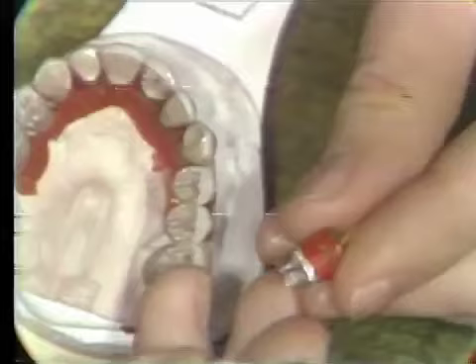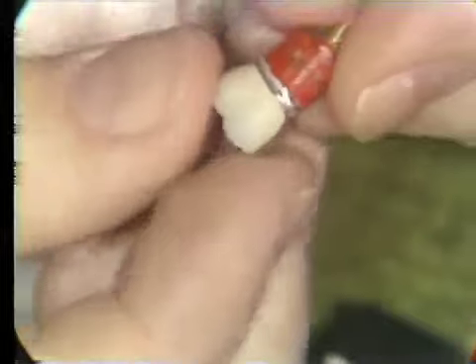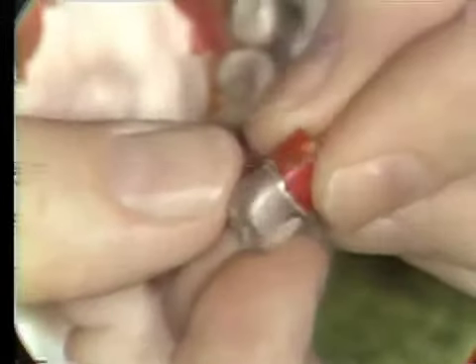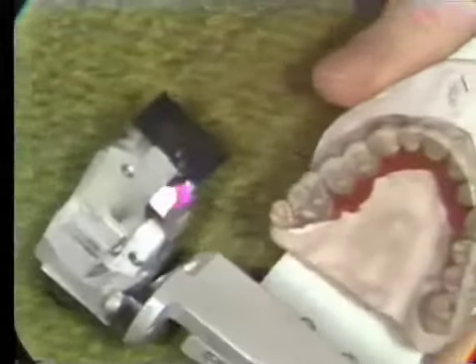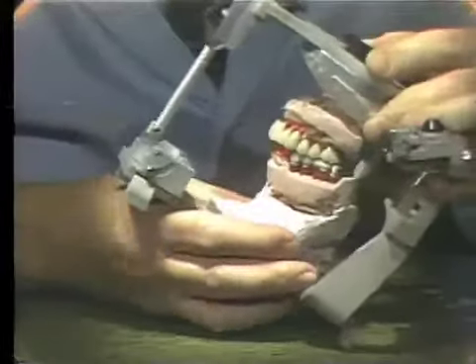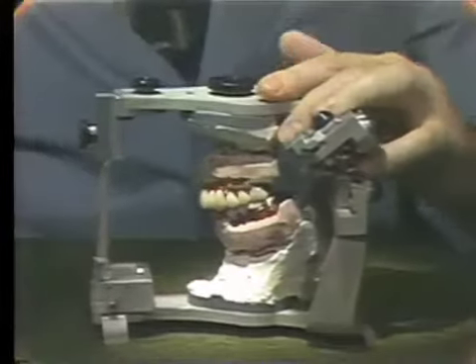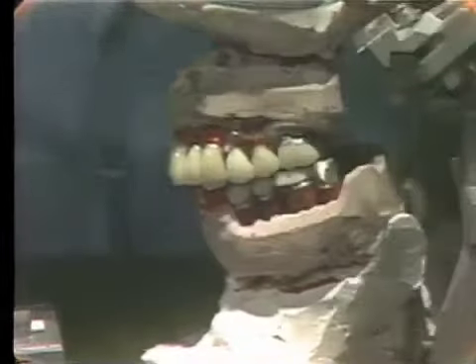Make sure that there are no irregularities inside the casting. These should all be sandblasted, and you individually adjust each casting so that it goes down on the die. Once you're assured that all of the castings are seated properly on the dies and all the dies are in their correct position in the master model, then we can verify the occlusion. We previously adjusted the anterior teeth so that they would maintain our contact. So with our shim stock, we check to make sure that we've maintained contact with our anterior teeth.